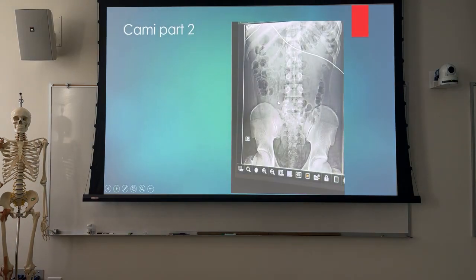Again, she's not here to tell us what's going on here. Bladder shot. Does anybody know anything about this one? Jeremy's marker, I think. The marker just says R. Oh, there it is.